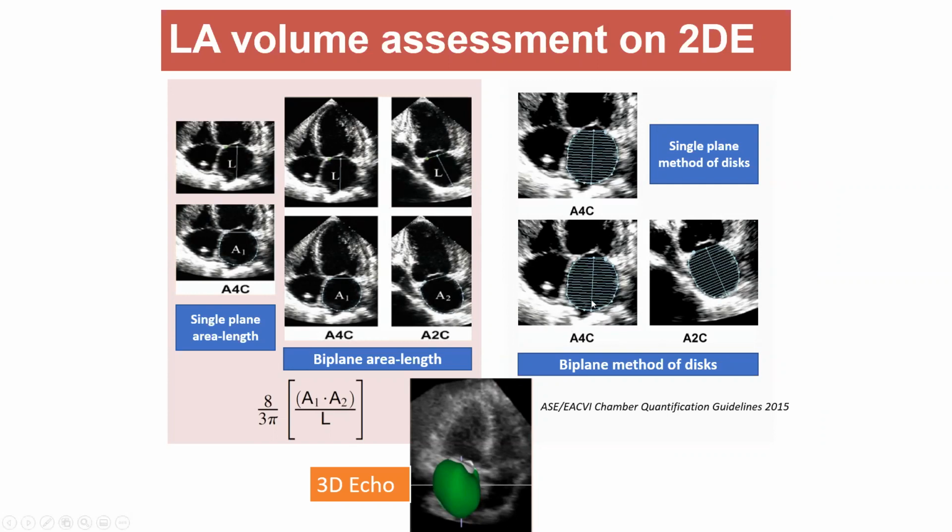And again, as with ventricular chamber dimensions, the Simpson's method, or the biplane method of discs, takes an area of the left atrium in the two chamber and in the four chamber view, you obtain a length, you specify a length from the mid portion of this line connecting the annulus to the superior portion of the atrium, and then the computer divides that length up into equally spaced mini volumes. And by knowing the width of each one of these discs or chips, you can arrive at the total left atrial volume.